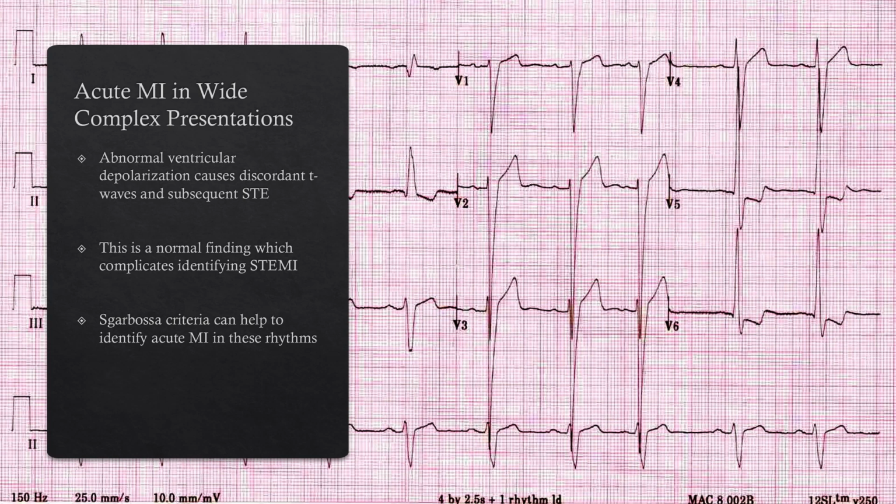In left bundles, because the QRS is negative in V1, V2, V3, you have these deep S waves, you end up with discordant ST elevation that is appropriate and normal for that patient, which confounds our ability to identify anteroseptal STEMI in that group. So now that you understand the relationship of that and how that works, we can then apply those rules and identify abnormal ST variations.